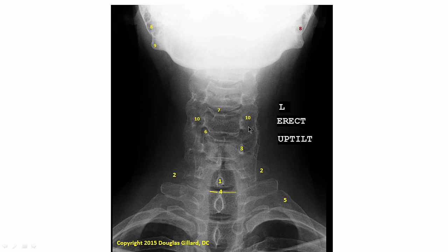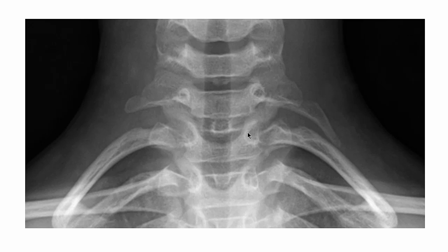Okay, I think that should about cover that in this quick version. Okay, let's speed through this. You can go to the long version if you want to see more about this, but real quickly, here's the first ribs, unquestionably. Or is that the first rib? What the heck is that? What is that? That's a rib.